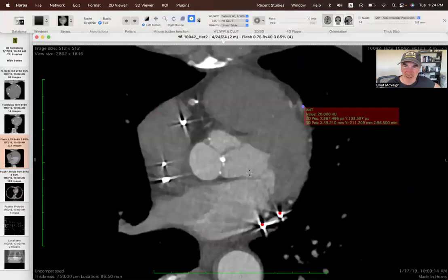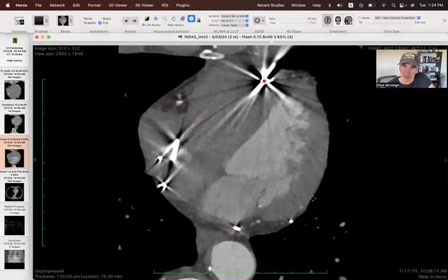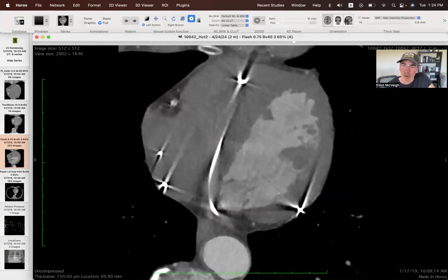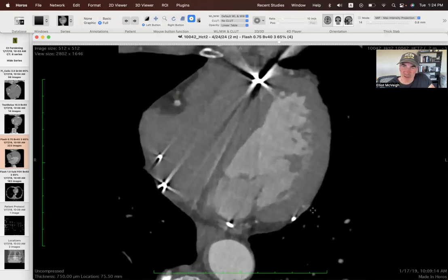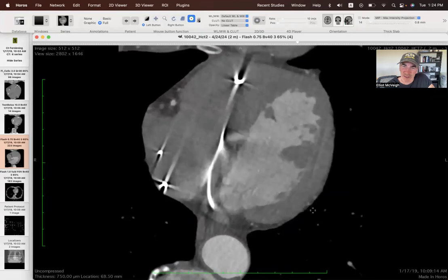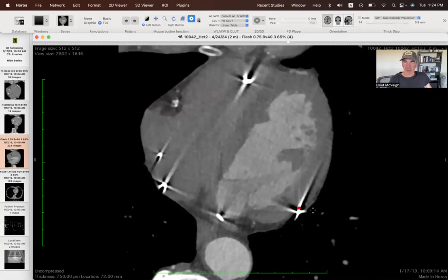So we have, using my left arrow again, I see the 4. Okay, so what I'm looking at down here is the ROI for the left lead, right? So if I push the arrow such that I go all the way off the end of the lead, see the lead stop there, come back, there's my position of my left lead.